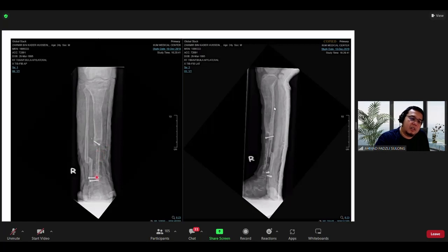So the vascularized tubular graft becomes non-vascularized. If the bone has no vessel, what does it become? Do you see these branch-like, spiky shapes? It no longer looks smooth. It has become dead bone. So what do you call dead bone?